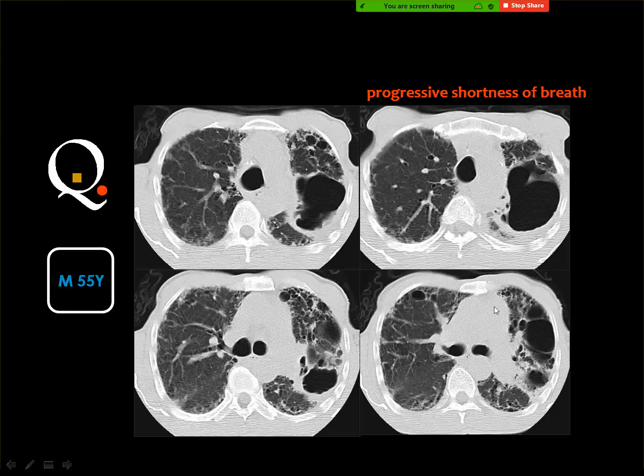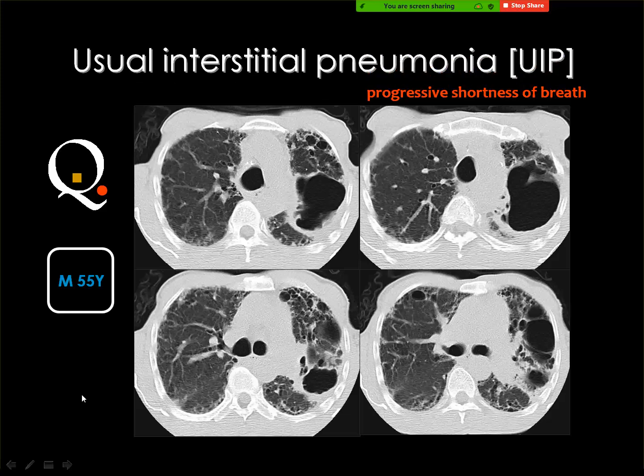What do you see? Is this a diffuse lung disease or focal? Yes, it's a diffuse lung disease. Which type? Interstitial, alveolar, miliary, cystic pattern. Interstitial with cavitary. Yes, this is interstitial disease with cavitations, and these cavitations are nothing but cystic bronchiectatic changes. If you look carefully in the subpleural lines, you can see collections of honeycombing everywhere. The combination of honeycombing and some bronchiectatic changes is diagnostic of interstitial lung fibrosis or usual interstitial pneumonia, and one of the complications of this disease is to get emphysematous pulmonary changes and cystic bronchiectatic changes.